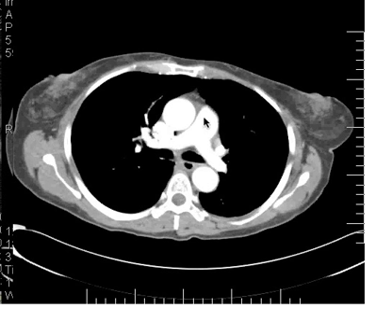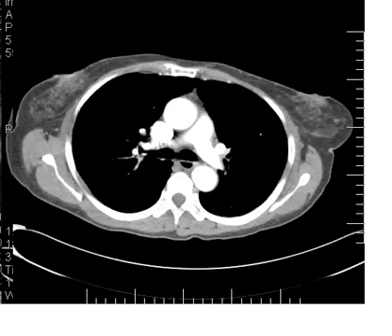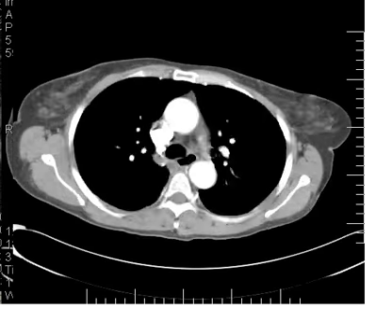So we're looking for filling defects either at the bifurcation here, a saddle type embolus, or in the right or left main pulmonary artery. And these emboli, when they do occur, tend to aggregate right at branch points. So if there's not a saddle embolus, you'll see it either accumulating here or here, right at the branch points of the distal main pulmonary arteries.